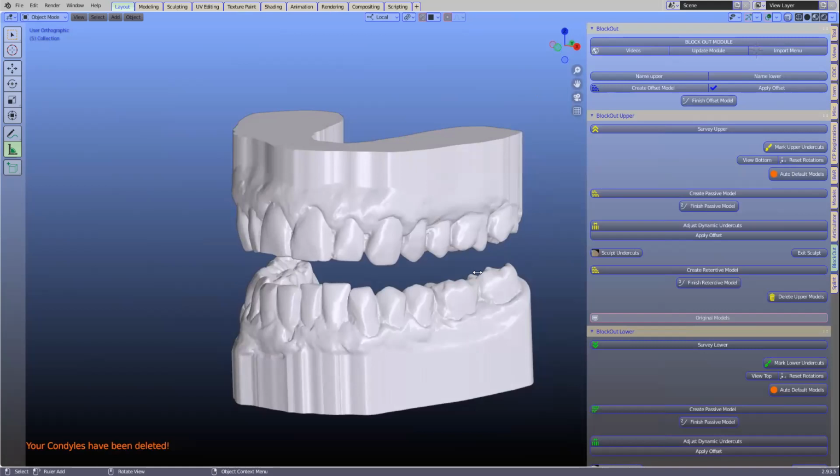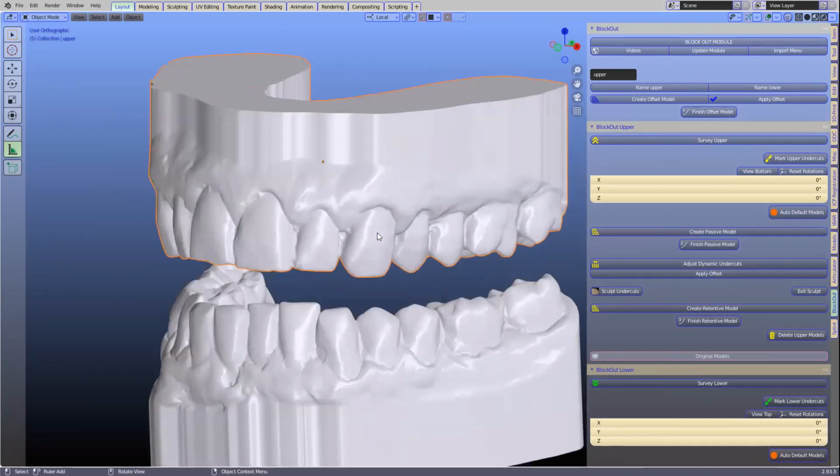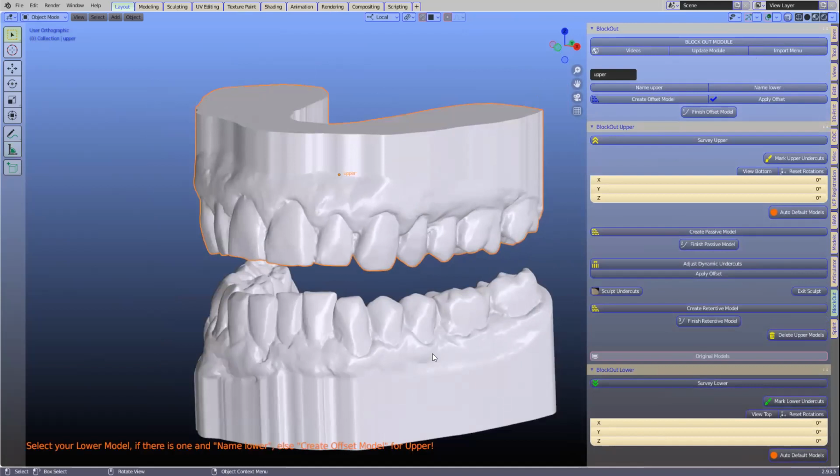Yeah. But if you were just making one bite plate, occlusal plate, then you'd keep the condyles and all of those because you want to do the dynamic occlusal cut towards the end of it. But in this situation, we don't really need it because we're going to make a halfway cut between the two layers. And Michael will explain as he gets into it.